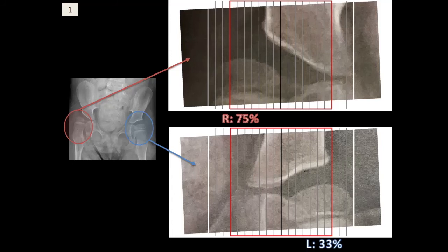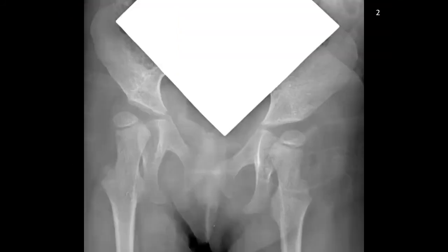So we'll go through the same sequence for each of the x-rays. Here's x-ray 2. Go ahead and go through the sequence of measuring it. Then you can pause the presentation here, write down your measurements, and then resume the presentation so that you can see the live video. We'll do this up to the 5th x-ray.